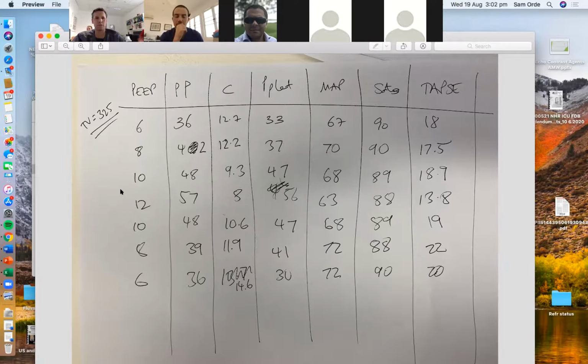Brilliant. Just a quick comment, a small observation that his right heart function is better as compared to your echo, because TAPSE was 13 on that and it's 18. So is it just with time, or did you do anything different? No, and I think it's probably more in keeping with the patient. TAPSE is sometimes a little bit tricky. I'd argue that the measurements that were made previously, I don't even remember, were maybe off axis and maybe being recorded in a less than ideal format. So we could argue whether TAPSE is the best measurement to do.